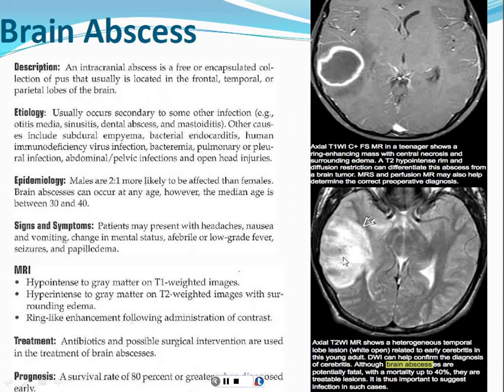Once again, if you see a patient come through with something like this, you may want to call the radiologist and say, hey, there's something really inflammatory going on here. Do you think we need to give contrast? And then once you give contrast, you can say, I'm really worried that this is a brain abscess. So they may have to do a craniotomy to get the abscess out.